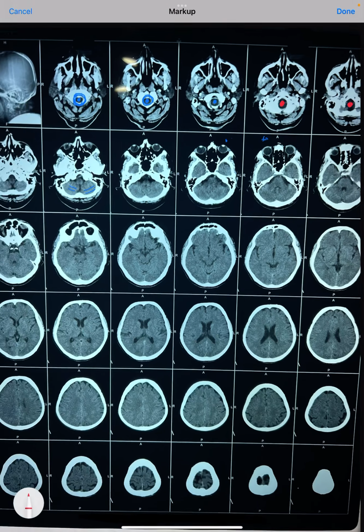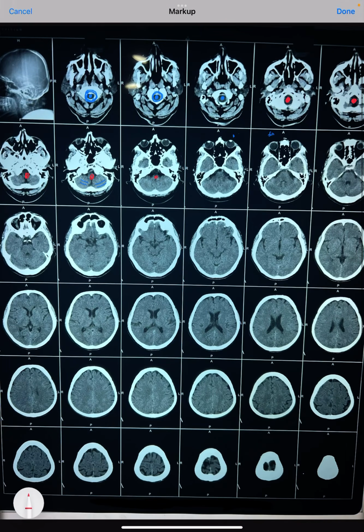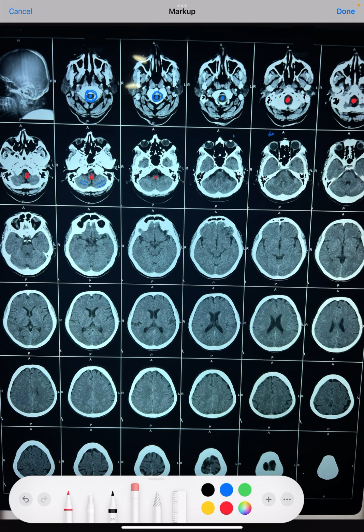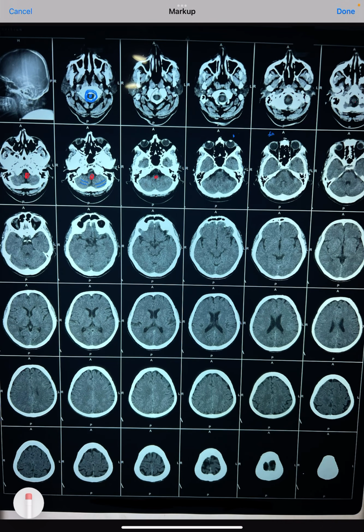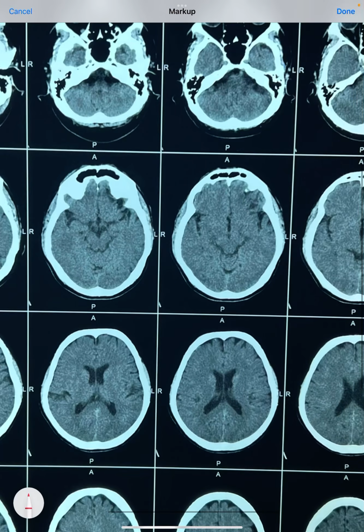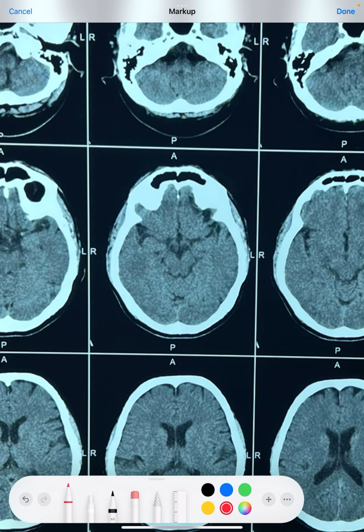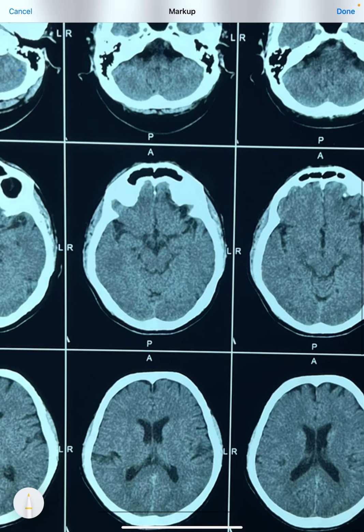Now, above medulla oblongata, what you get is basically the pons. And now we can very easily identify pons because the pons is almost completely circular structure, and midbrain is like a butterfly like structure. So we can very nicely make out here, if you see, that this structure is butterfly shaped here.